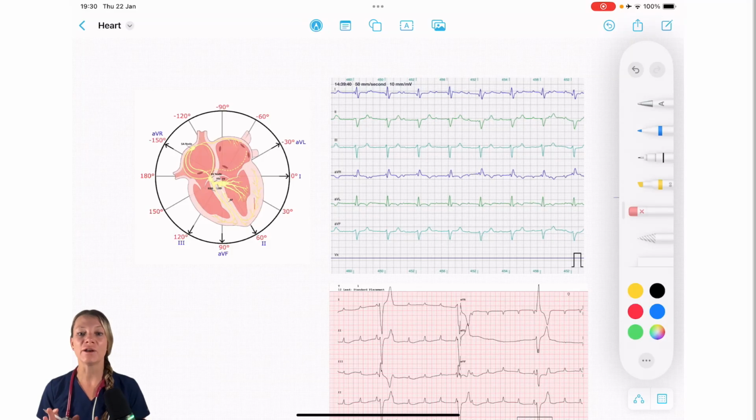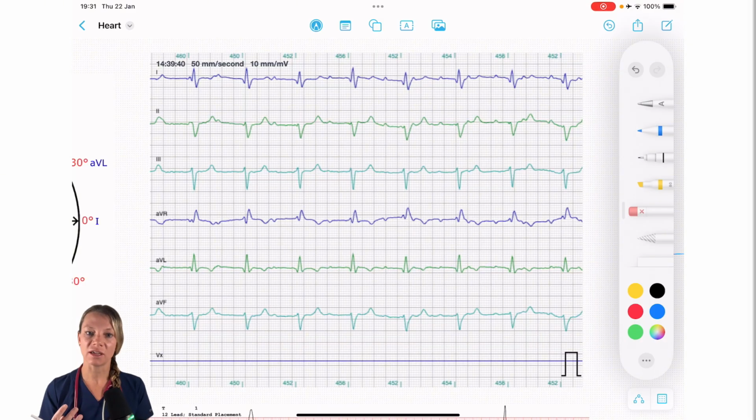You're evaluating an older cat admitted for a routine procedure, but her heart rate is lower than you'd expect for a hospitalized cat. She's bright, calm, no history of collapse. Nothing about the exam feels particularly dramatic until you look at the ECG. The atrial activity looks regular, the ventricular rhythm looks regular, but the two are completely unrelated. This is complete heart block.